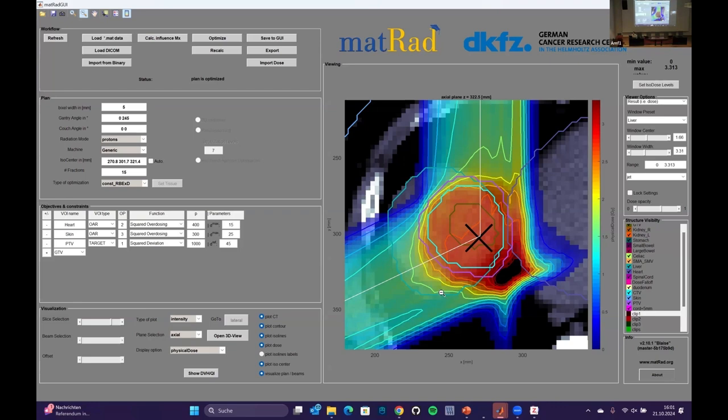Just because we have this problem of peaks shifting into lung tissue where nothing is stopping them, up to the border. So you see, maybe a proton liver treatment is not as easy and straightforward as just switching to protons, but you really need to think of how you do your positioning and how you verify that the tumor is where it's supposed to be. So with great precision, with these great Bragg peaks, comes great uncertainty in depth.